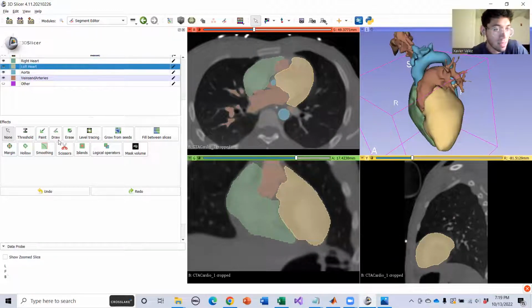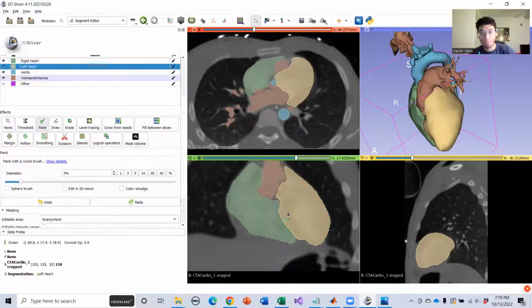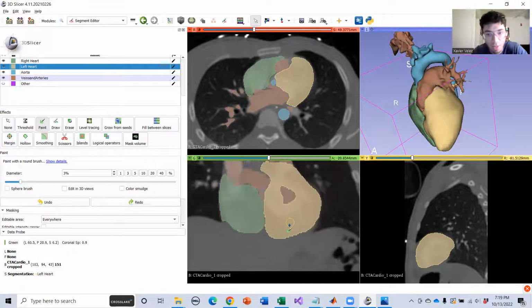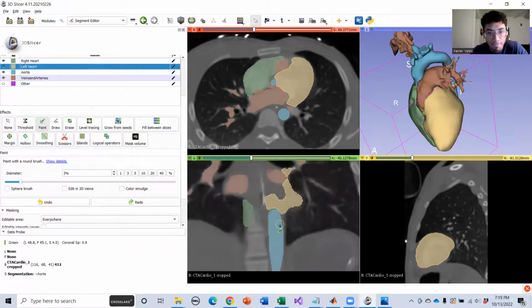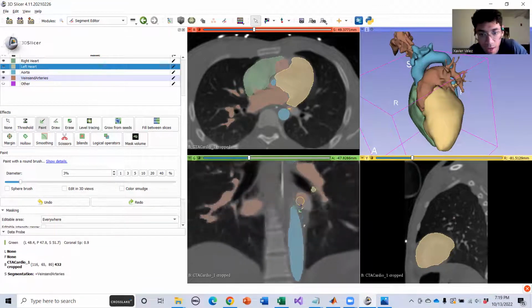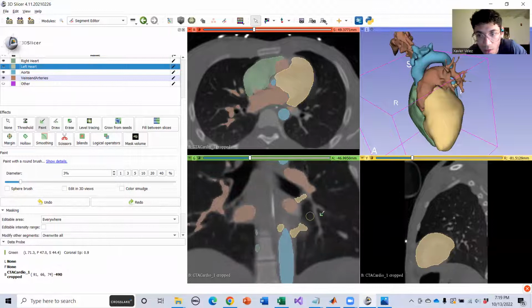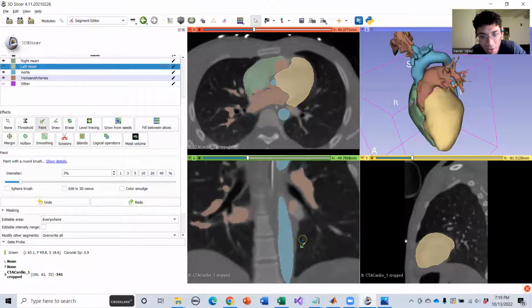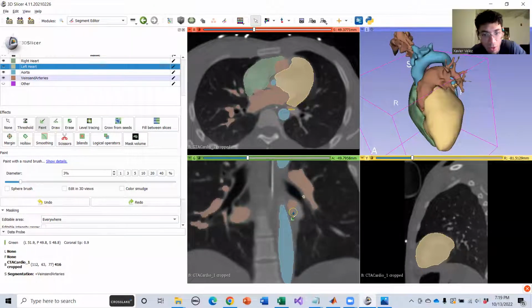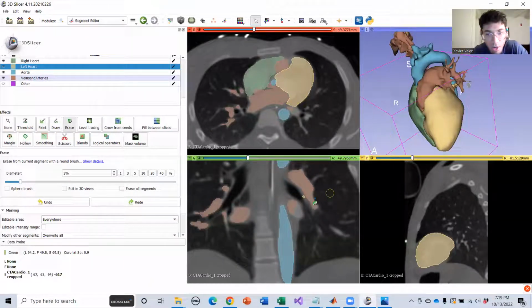So anyway, let's stop messing around, and let's just take this one frame at a time. So I'm going to start at the end. We're going to start here, right, where there is no left heart. It doesn't exist, right? And then we're going to look at all that and say, is that actually left heart? I don't know. I mean, it looks like that is still part of the aorta. That looks like some sort of branch. I mean, I don't know what that stuff is. So I'm going to say, all right, I've deduced that that is not actually part of the left heart.